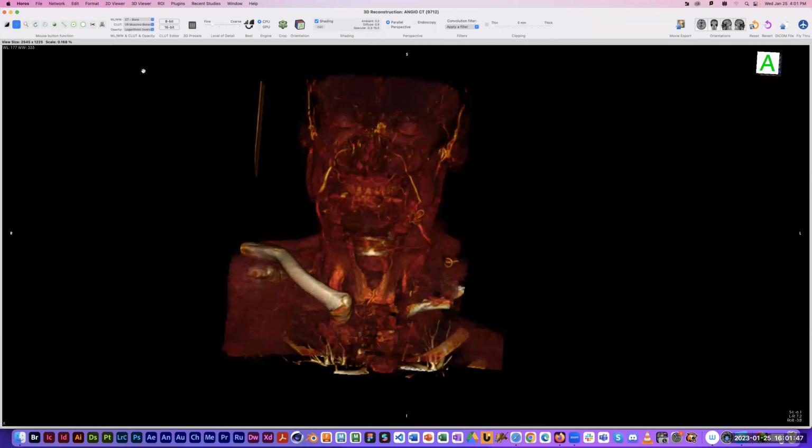And then when the download menu comes up, you just choose image. Okay, now I know why it wasn't working. You'll download it as a zip. Then wherever it downloads it, like in your downloads folder, just double click on the zip and it'll expand it into a folder.